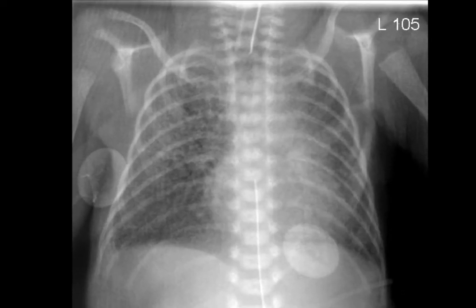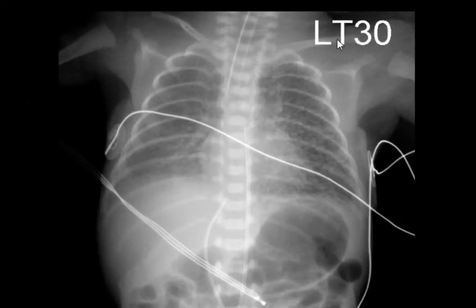This is a less severe case, although he also has diffuse interstitial emphysema involving the entire lung on the right side, under tension because the diaphragm is flat. He has mediastinal shift to the left because if you'll notice he's actually turned to the right and his mediastinum is to the left. This patient has very fine lucencies seen throughout the left lung, and again there's some degree of tension here because the diaphragm is a little bit flatter than the right side. You know, even though this is relatively subtle compared to some of the examples I've shown, you really need to diagnose it at this point.